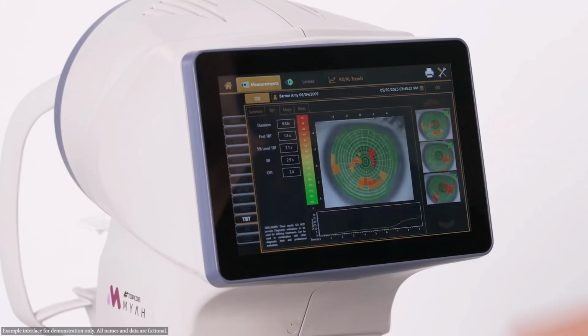The TBT tab is essentially the same as the Summary tab, except that the data on the left applies to a single acquisition. In addition, the duration of that particular measurement is stated. Select which acquisition you want to view by clicking on the thumbnail.